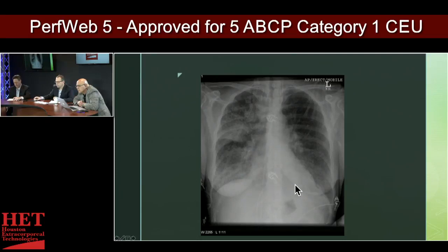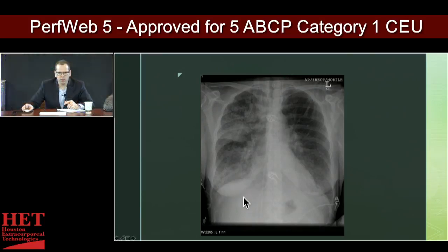You can see the diaphragm here. You can see it here, just underneath the breast. This line here is simply, you have the liver behind here, which is obviously a dense structure. You have the diaphragm, and then you have the breast. And so I think that this interface that you see here, that oval-looking portion, is just tissues overlying each other. So I don't think that that's anything of significance.